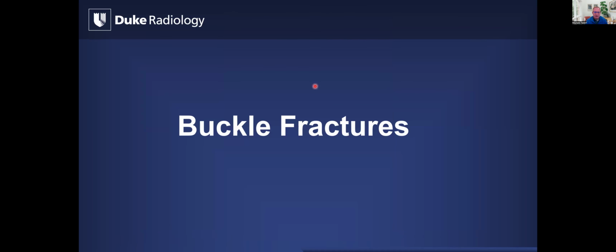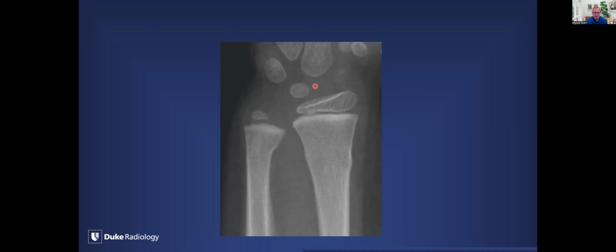Okay, buckle fractures, so we kind of covered some of the themes around that. Again, where are we looking? We're looking for that transition between the thick cortex and the thin cortex. So this is the diaphysis as we go to the metaphysis. And right there, we can see some buckling. Here, thick cortex to thin cortex, so right there, point of weakness. We get a little bump right there.